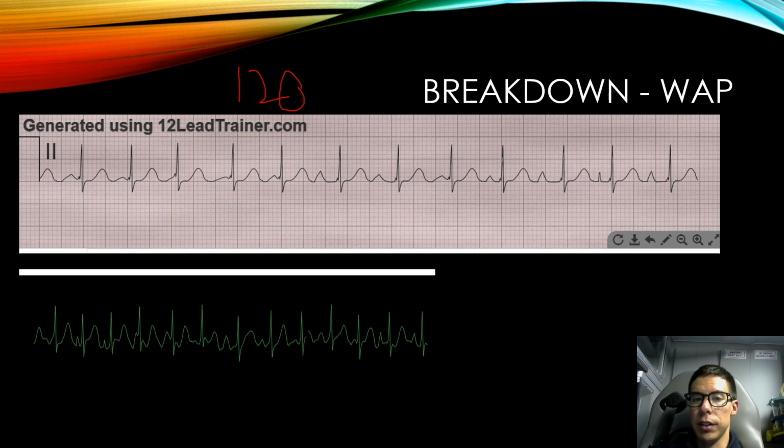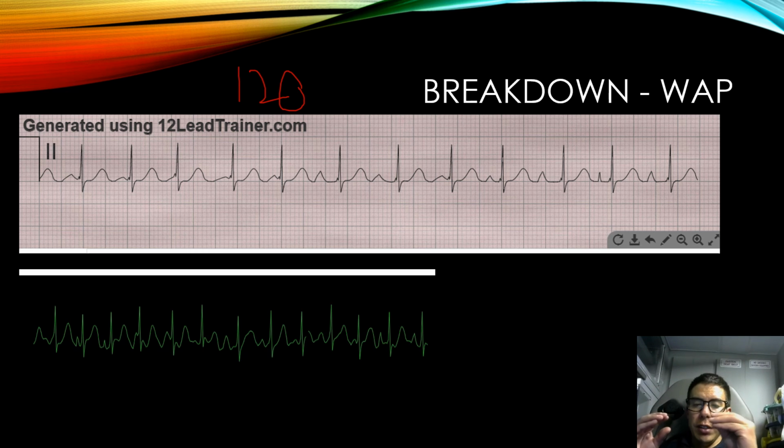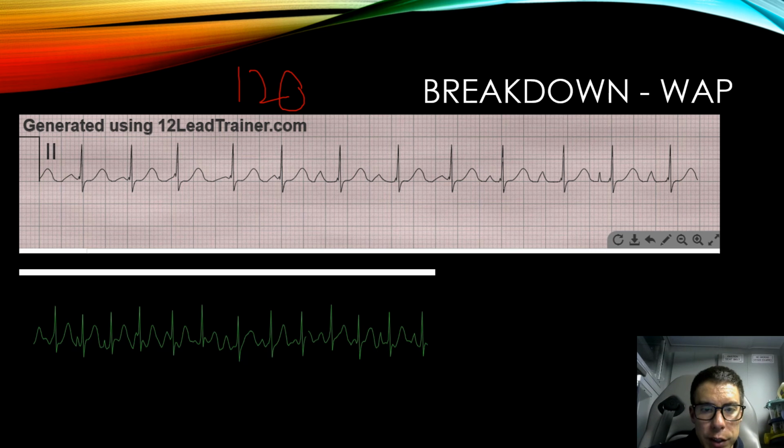And in this case there is, or at least there are no extra ones, because they're there in some cases. If the impulse is really close to the AV node, remember it goes both ways at the same time. So you might only see a tiny little glimpse of the P wave before the QRS starts, and then that will overpower the P wave activity, so you won't see it. Like in this one, see that little tiny notch right there?